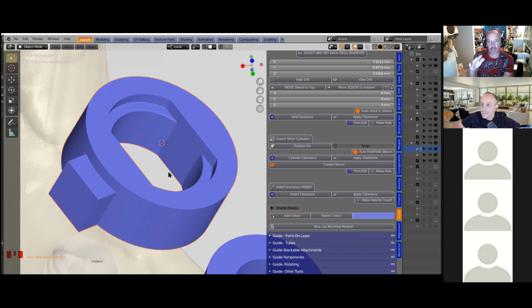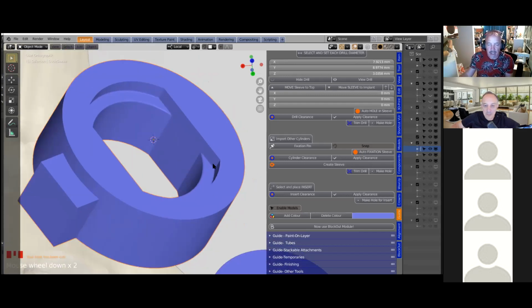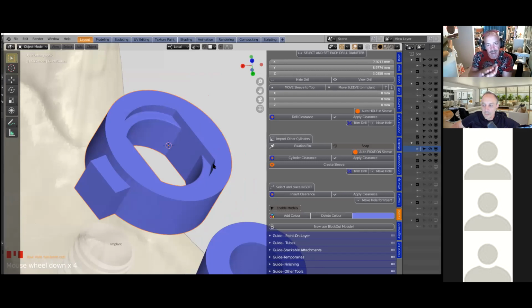Now all of a sudden you're putting in a metal insert with a lip around it, which does not engage fully. With ours, you can see how it's been inset like this, which means when you put the metal sleeve in, it's completely flush with our sleeve. So that means 9 millimeters will be 9 millimeters.